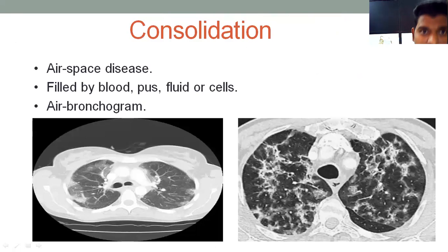And once again, consolidation is the commonest radiological pattern you see in day-to-day practice in pneumonia. But as you know, consolidation doesn't always indicate that you are dealing with a true infection. You may get a consolidation in other non-infectious conditions also. ILD is one of the conditions that you should note, because in organizing pneumonia, the presentation will be a consolidation. Here you could see the consolidation, nothing but airspace opacity, with airways or alveoli filled with blood, pus or fluid cells. Classically, you will see an air bronchogram.